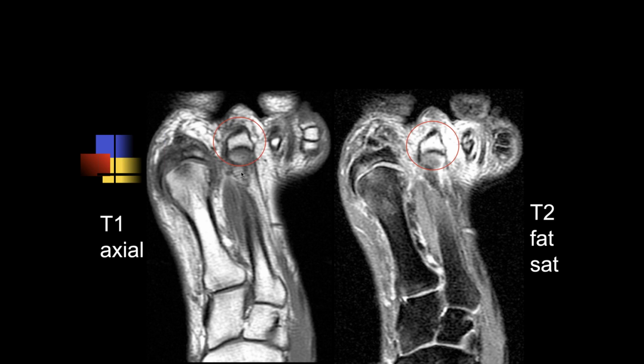The phalanges are normal. Okay, so just the direction it's going, is this like a subluxation, a hammer toe type issue? What's causing the hammer toe wouldn't cause the signal changes you described. What's causing the signal changes you described? If you have abnormal pressure changes on that phalanx.